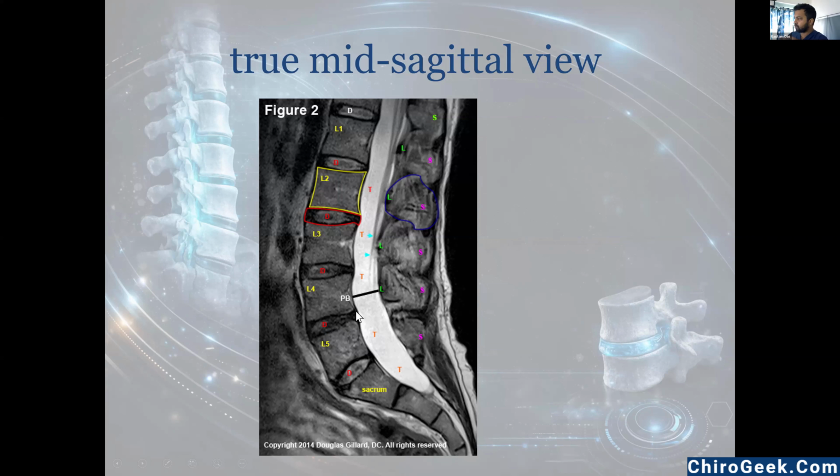You first identify that, and then we want to see the disc, whether the disc is bulging out or there is an extrusion, sequestration, and so on. I will show every image. And the canal diameter we can also measure. Usually the canal diameter will be around 15 to 20 mm. If it is less than 10 or less than 12 itself, we will call this a canal stenosis.